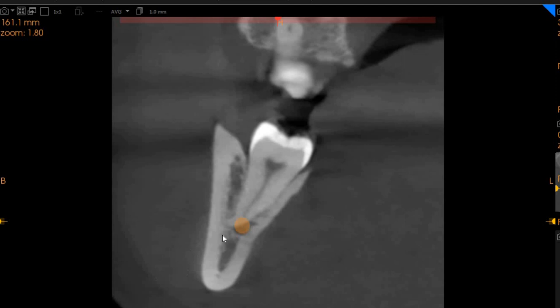So when we remove the nerve highlighting, you can see that the inferior alveolar nerve is right here, and the canal is being compressed by the apex of the wisdom tooth, the distal root of the wisdom tooth on the lower left hand side. So both in these areas, you can see that the inferior alveolar nerve is being compressed by the lower left wisdom tooth.